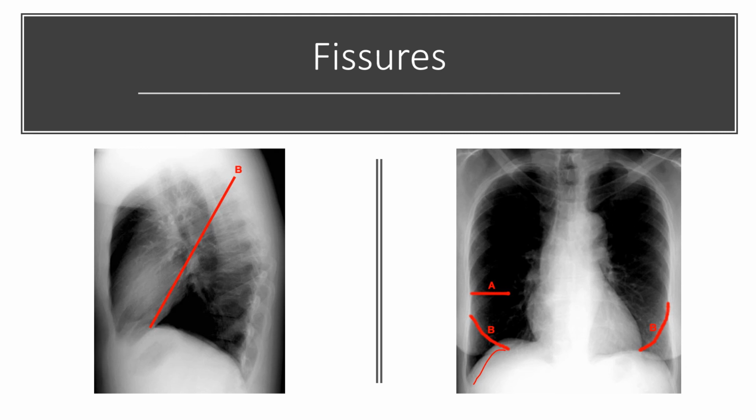And so normally, are you supposed to see these? No, you're not. So if you do see a fissure, it's a bad sign. That means they either have a lobar pneumonia, or they have a small pneumothorax, more common in babies, in between the fissures, or they could have some free-standing pleural effusion hanging out in there. So there could be a couple of different things going on, whether it's inside the lung or outside the lung. Usually if you see it with a pleural effusion, it's more of your exudative, thick infectious disease type pleural effusion.